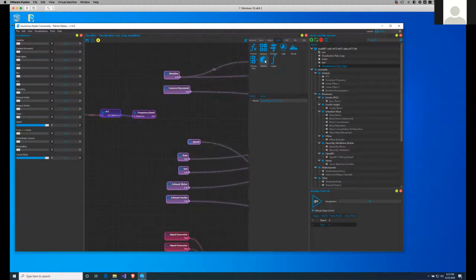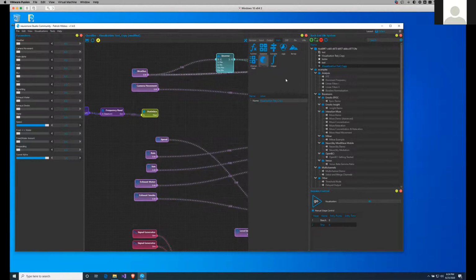And then we take the statistics node out of our mathematical nodes in here. Say, oh, let's feed that in. Let's say we do mean over the interval of 1 second. And now there's the mean. So let's look at how the output of that particular statistics node looks.